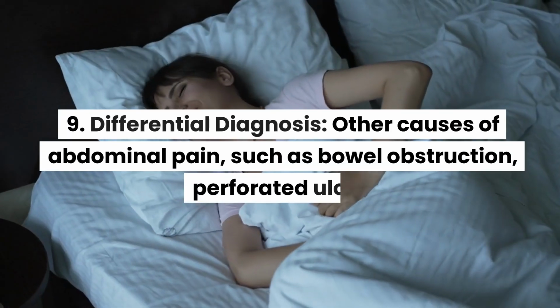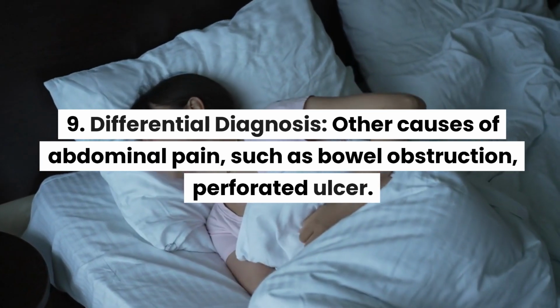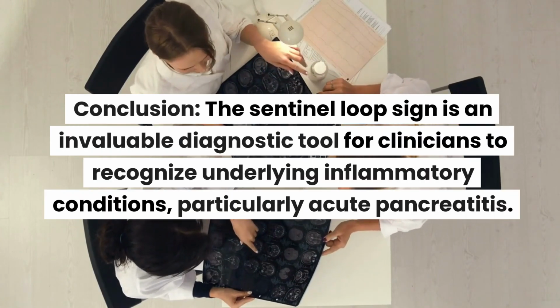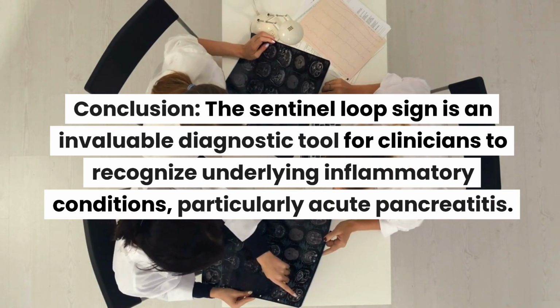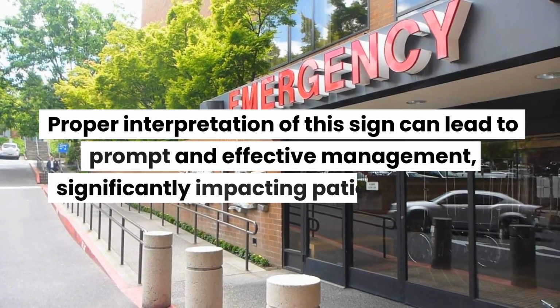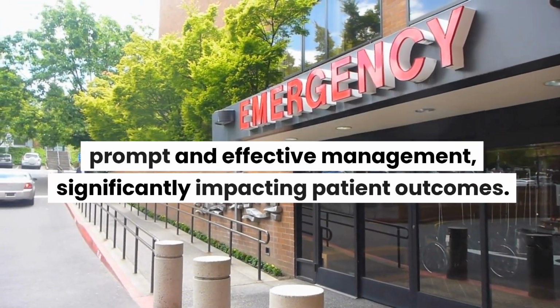9. Differential diagnosis: other causes of abdominal pain, such as bowel obstruction, perforated ulcer. Conclusion: the Sentinel Loop Sign is an invaluable diagnostic tool for clinicians to recognize underlying inflammatory conditions, particularly acute pancreatitis. Proper interpretation of this sign can lead to prompt and effective management, significantly impacting patient outcomes.